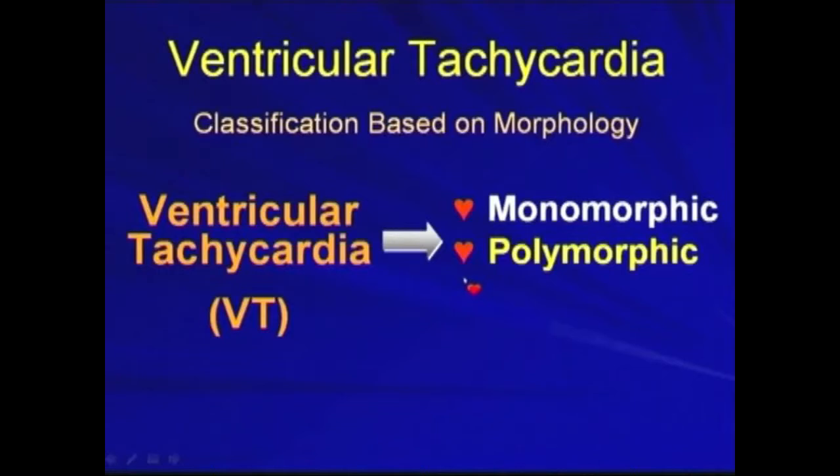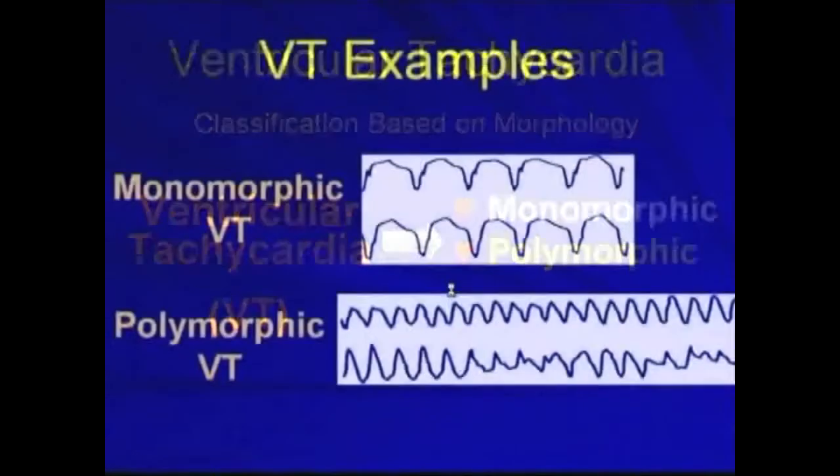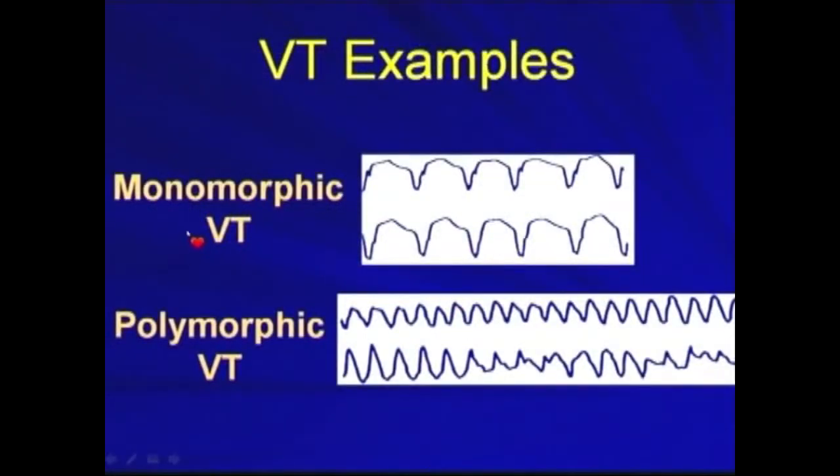Now, let's look at polymorphic ventricular tachycardia. In contrast to monomorphic VTAC with a single morphology, polymorphic VTACs have multiple morphologies.